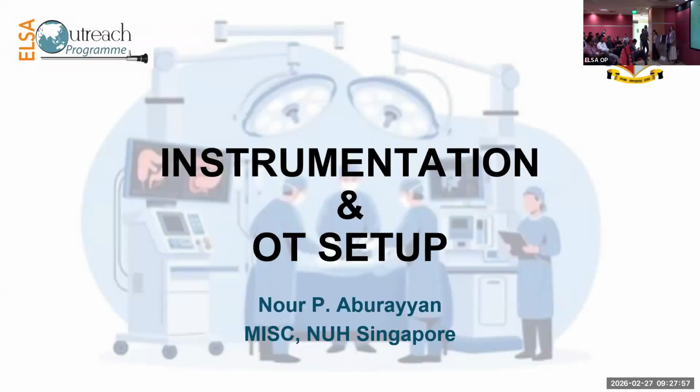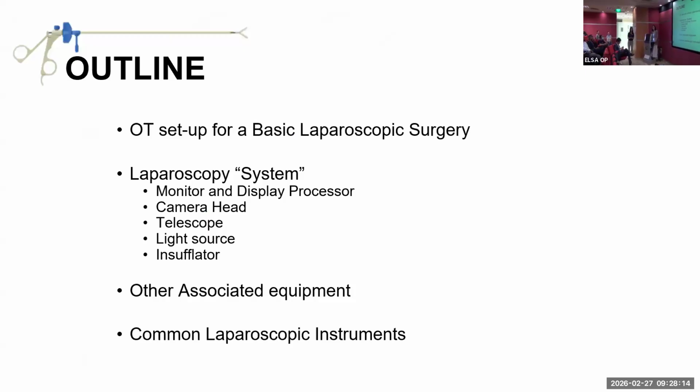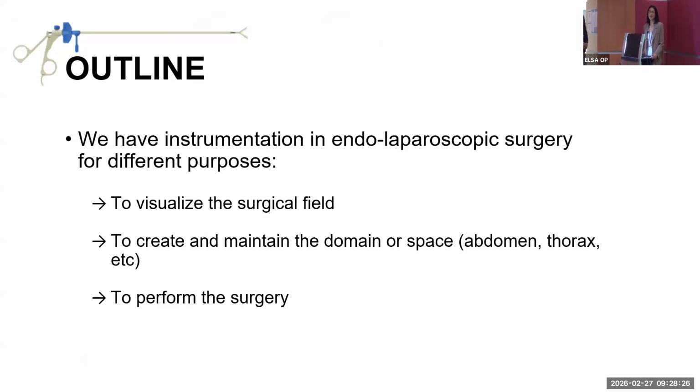Okay. So again, we'll just of course start with the instrumentation already set up for laparoscopic surgery. This will be a quick one, so it wouldn't be so dragging in the morning. So I'll be discussing the setup for basic laparoscopic surgery, the system we use, the instruments and the monitors, other associated and special instruments, and of course the most common laparoscopic instruments that we use.